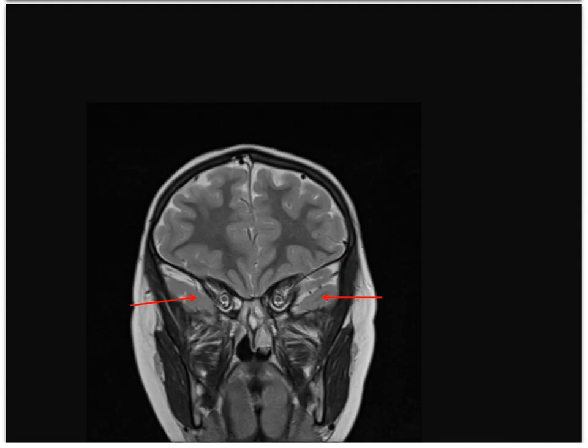On the next slice, the tips of the temporal poles now are visible. And here we can see 3 unnamed cortical veins. The same image also shows us the muscles of mastication. We'll hear a little more about those later.